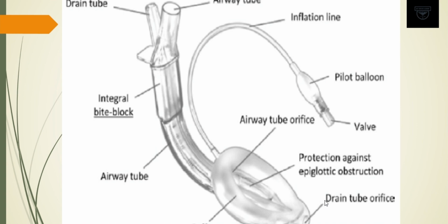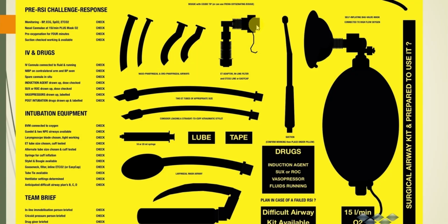So you normally utilize it in short surgeries, for example, orthopedic surgeries, maybe possibly an hour, short surgeries, in and out. This is a great device. So you would usually have your checklist as to what you would use to intubate your patient, right? This could be a checklist.